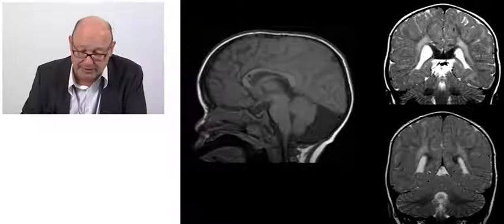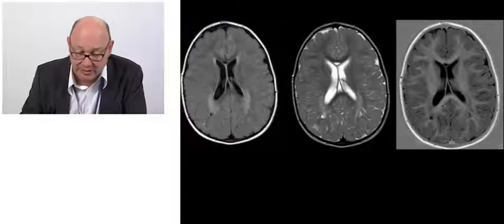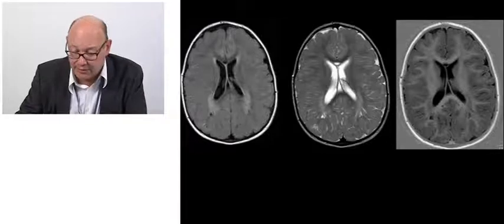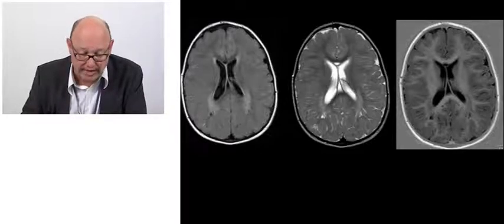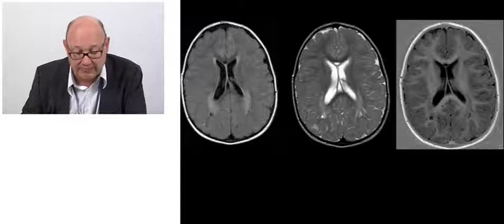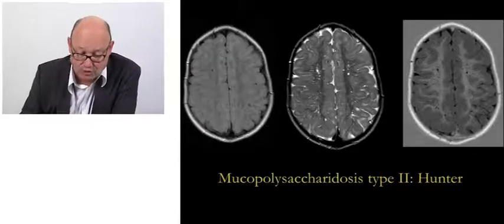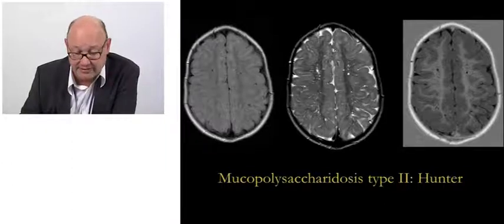They actually look like just ordinary perivascular Virchow-Robin spaces, but when you see them in the corpus callosum, notice over here, if you see this typical distribution, you should consider the potential diagnosis of a mucopolysaccharidosis. Actually, this was the case in this patient, who was later confirmed genetically to have Hunter disease, which is mucopolysaccharidosis type 2. Okay, let's take a look at pattern analysis by vascular distribution.